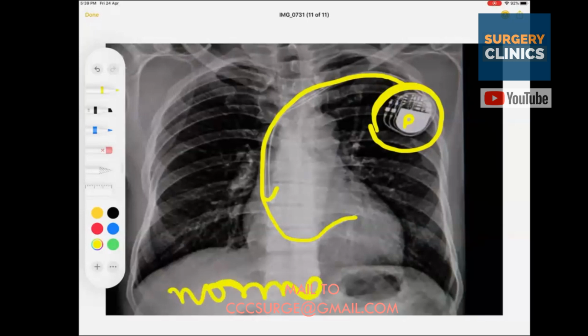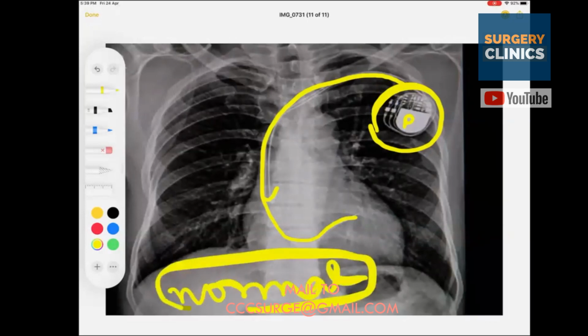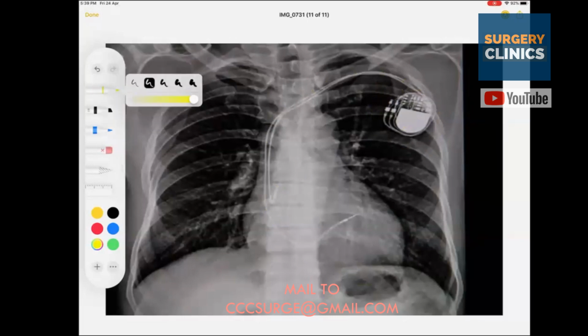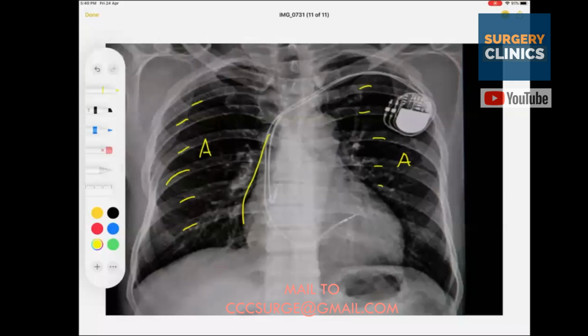If you can see again very quickly, if I have trained your eyes, this patient has everything normal except for having a pacemaker. Now if you have very good eyes, then maybe the bronchi are a bit prominent, but again, we'll not stop. But A is normal. Bones, that is B, appear to be normal. Yes, they are normal. C is the heart shadow. Yes, sir, it is normal. D is the diaphragm. Sir, it is normal.